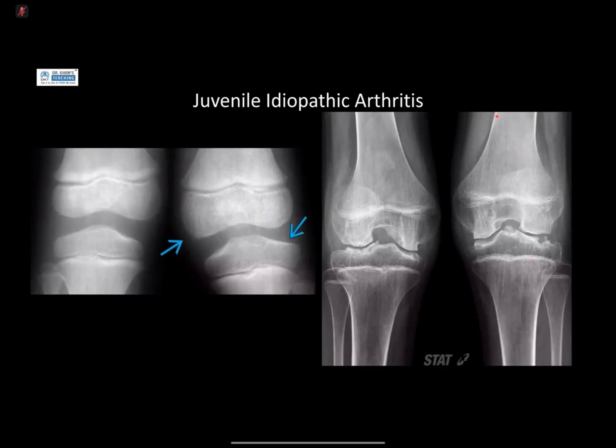This patient has these long gracile bones, flaring of the metaphyses and epiphysis with osteopenia, erosions, and all of this with joint space narrowing. So remember, in inflammatory pathologies, even in kids, your joint space narrowing is diffuse because it is coated by inflamed synovium, versus in an older patient where osteoarthritis is quite focal because it's due to the weight-bearing aspects. So inflammatory diseases affecting the joints often give you diffuse joint space narrowing and not focal. Okay.